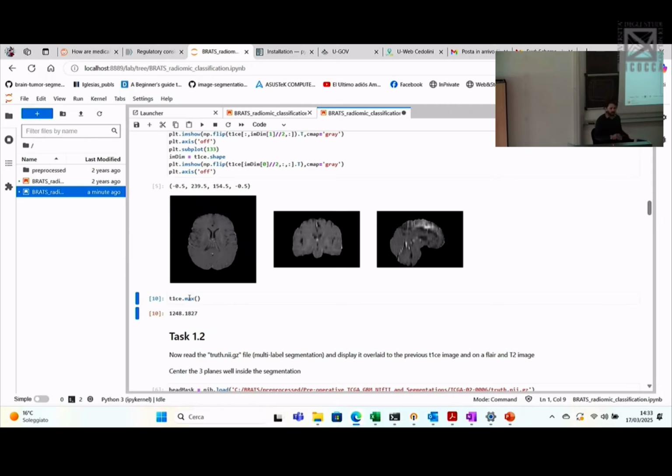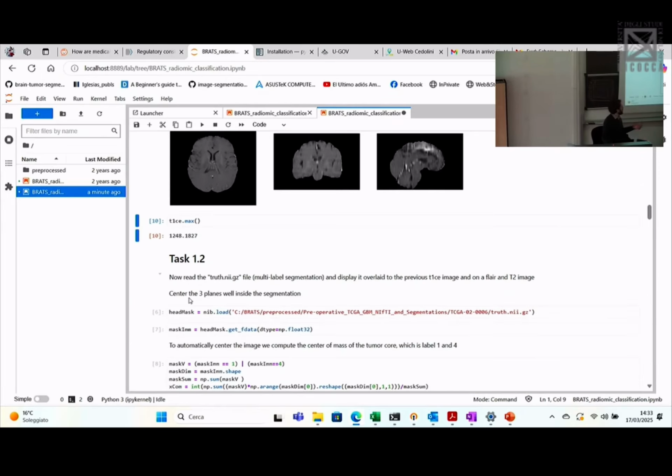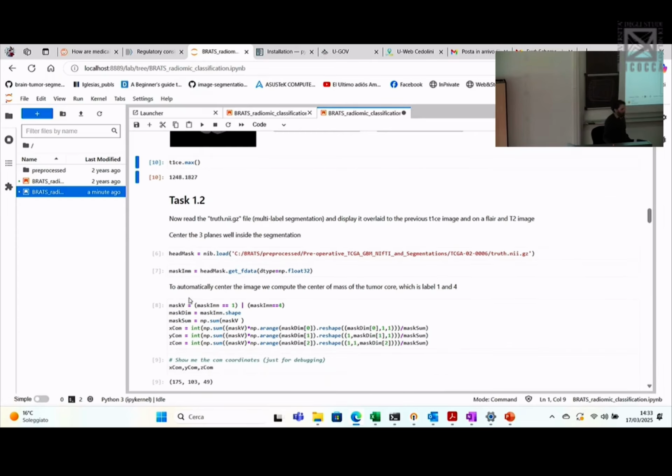This specific subject is 1,000, another will be between 0 and 1, and another one will be between 0 and 1 million. So it's generally adjusted qualitatively. You can also play around with the other sequences just to take a look at how they look, and you will see that they've been perfectly aligned pixel by pixel.